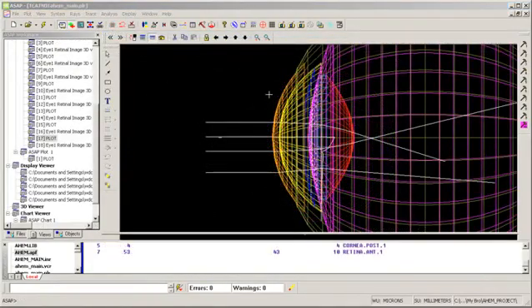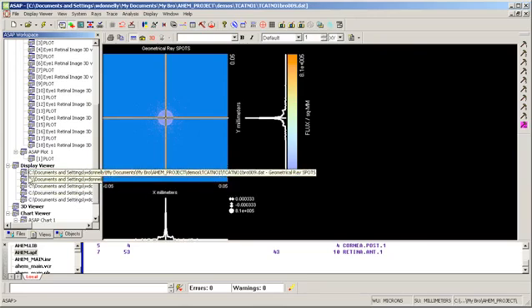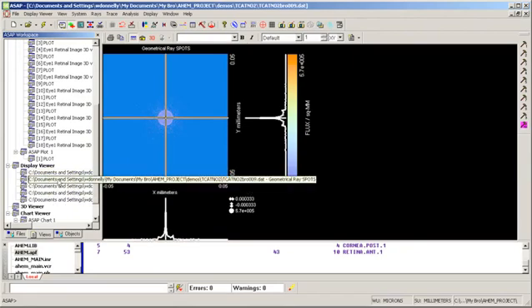Alright, so I get a graphic here where I show some rays scattering, but I'm really interested more in the retinal PSF. So this is it here, and if we look at the numbers here as far as maximums go, what I've done is I've set various levels of scatter attenuation. So my particle size is staying the same, but I'm increasing the density of the particle size in the eye lens. So I've got 5 different levels of cataract set up, much like you would for nuclear cataract. And if I step through the different levels, this is the first level, and the second level, you'll see the numbers change up here as far as maximums, and over here, intensity of that point spread function.